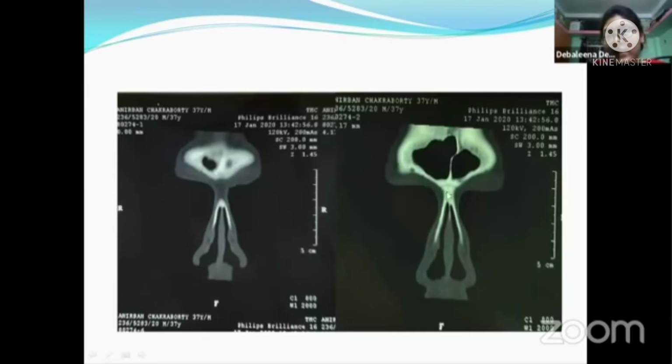In the next cut, we see the two nasal bones separately, and the frontal sinuses on either side are well pneumatized. This is the interfrontal sinus septum, which lies in the median plane inferiorly, and it may deviate to either side as it moves posterior superior. This nature of the frontal sinus is known as the scalloping nature and is lost in the mucocele.